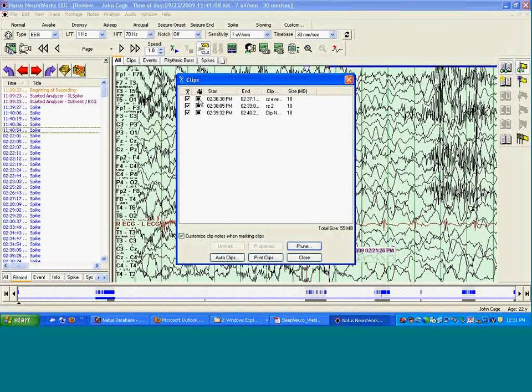If I left click on this, the icon changes and it displays a half-shaded square, which indicates that you are selecting the squeeze or compressed video option. You'll notice the corresponding change in our file size. If I left click on this again, it will remove video completely from the clip.